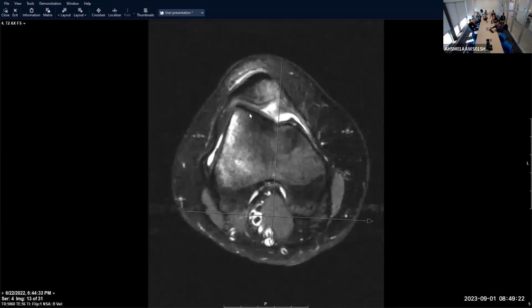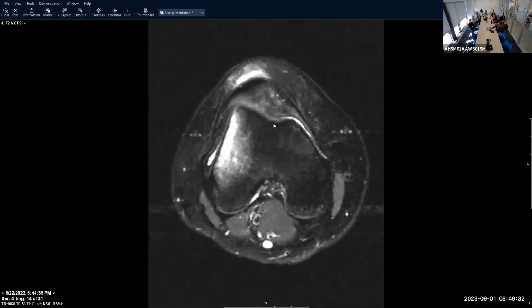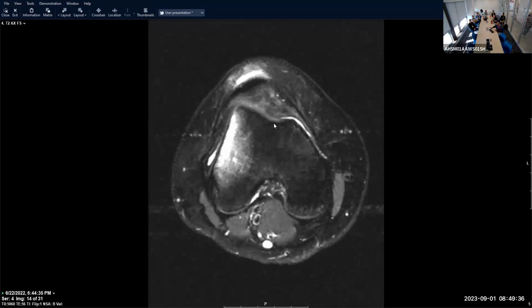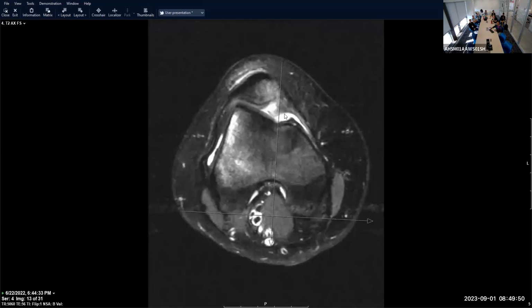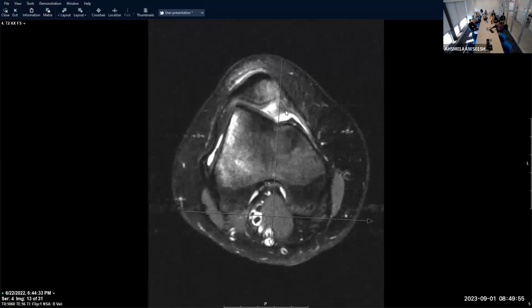The lateral trochlear facet is pretty steep, and this should be keeping the patella in place. There's all sorts of femoral trochlear measurements one can do. You can do the lateral inclination angle, which is essentially this angle. You can do a ratio of the lateral trochlear to the medial femoral trochlear facets. You can draw a line here and measure the trochlear depth. Honestly, I just look at it and I'm saying to myself, is this shallow and dysplastic, or is there a nice groove here? This looks pretty good to me.